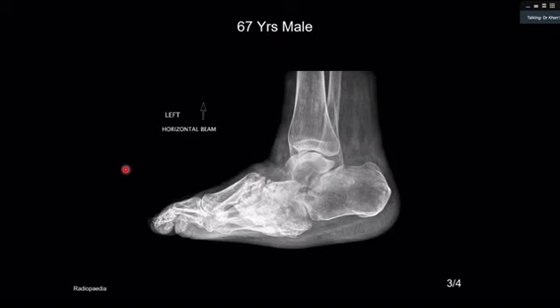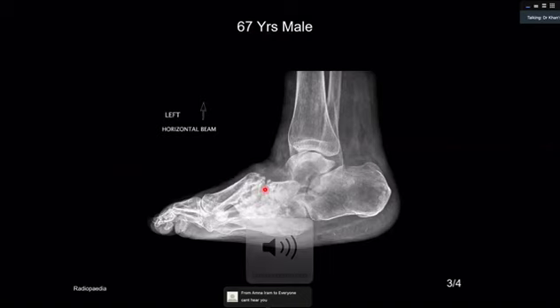So your diagnosis? My diagnosis, Charcot's foot. Excellent. So this is Charcot joint, classical. We will cover it in our 4th chapter. But here what happens is that this is a diabetic foot where there is bony destruction. Look at the density, which is increased. And the inference is that because the navicular is destroyed, there is a dislocation there. And you can see that rocker bottom effect.